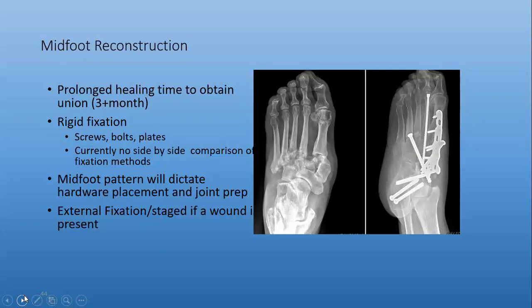Midfoot patterns, usually there's a lot of hardware that has to go through the midfoot because that's where that collapse happens. And then using external fixation to stage it, or if there is a wound, or if there isn't a wound, using external fixation. So who wants to take this X-ray on the left-hand side?